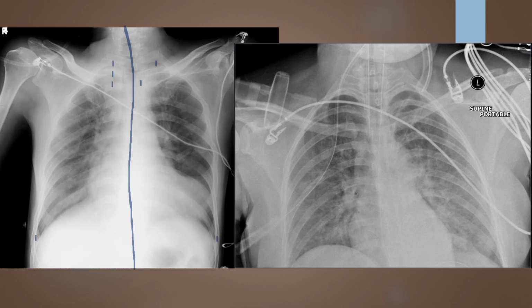Now, the quality of this next image is going to depend a little bit upon the purpose of the image itself. You can see here that this patient has an endotracheal tube. So here is our endotracheal tube. We're watching it come down. It's going to end about right here. If the whole purpose of this image was to identify ET tube placement and the patient was otherwise having their chest x-rays done separately, I might approve this one for endotracheal placement.